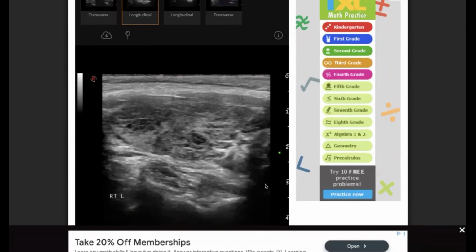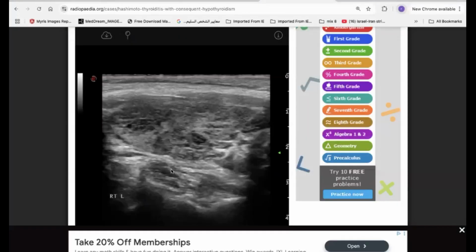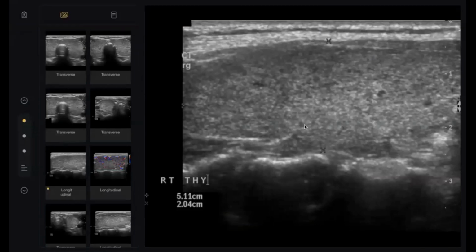What's your opinion? Do you think this is the same echogenicity as Graves? I think there is a very big difference. At least you can swear 100% this is markedly heterogeneous. But look here. Okay, it is mildly heterogeneous, but almost not the same. Big difference. My colleagues, if you give the examiner two logical differentials, he will be happy.